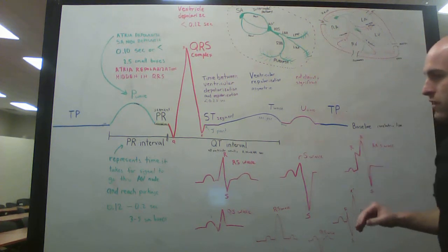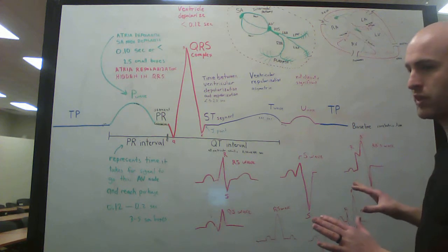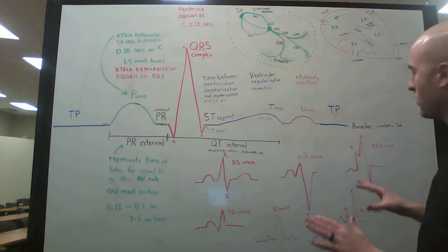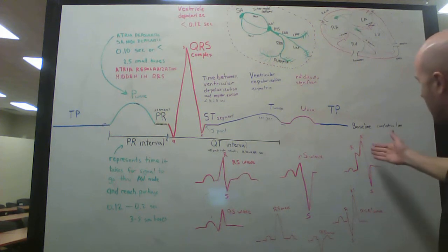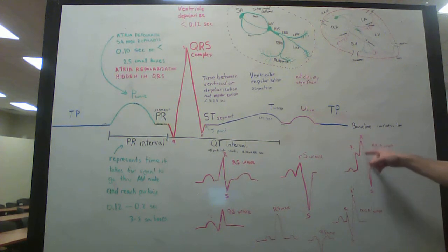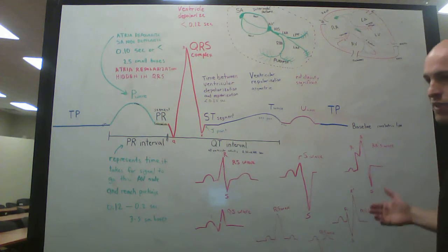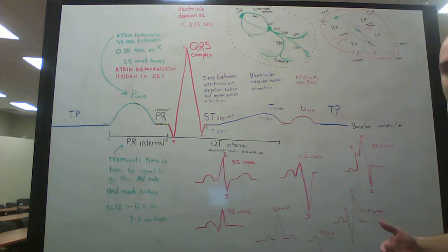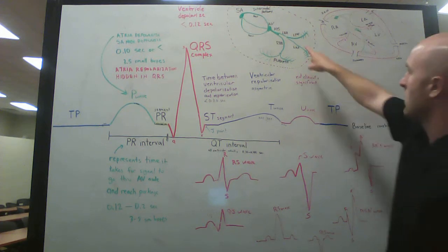And so what you see here is that you essentially have to transpose 2 separate ventricular depolarization events on top of each other, and you get this kind of telltale sign that they call the bunny ears here, where it's like 2 little spikes. And what this really is, is the electrical representation on an EKG of 2 ventricular events occurring in different time periods, shortly one after the other, because this was blocked.